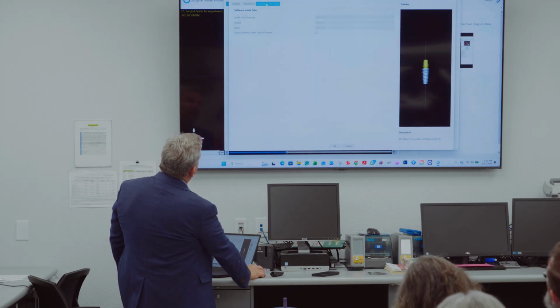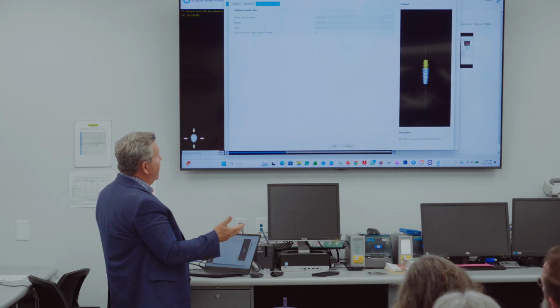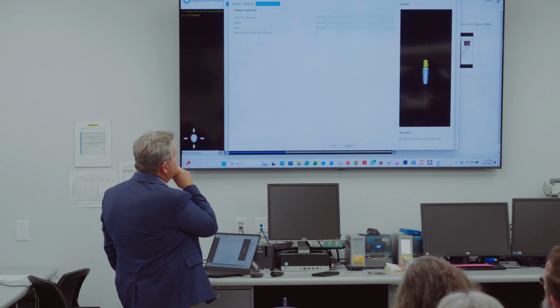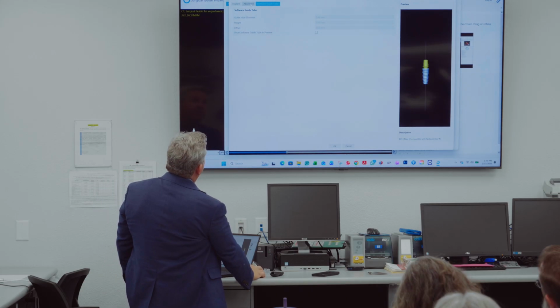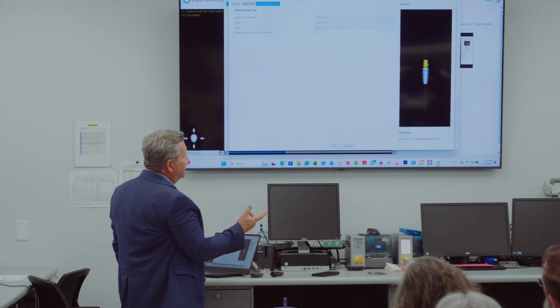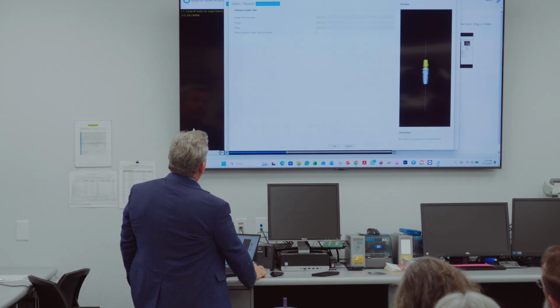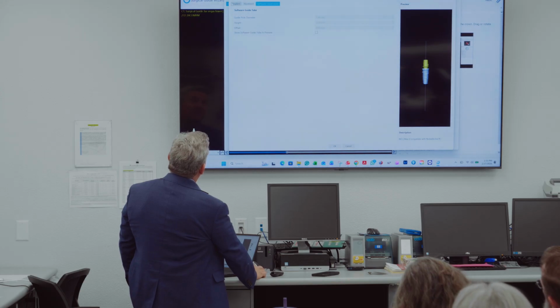All right. And it's going to automatically choose the guide tube you need. And notwithstanding Corey's discussion about whether you need them or not, if you choose to use them, this is one of the places you can actually choose the guide tube. And I'll show you a reason why it might not be necessary later on as well that he doesn't mention. But there is a risk, and I've seen studies on this, there is a slight risk of bumping the guide with the drill surface and creating debris in the osteotomy, which is not a good thing. But if you're careful, that probably won't happen. And that's what Corey was talking about. So you've got these three windows: implant, abutment, software, or the guide tube.